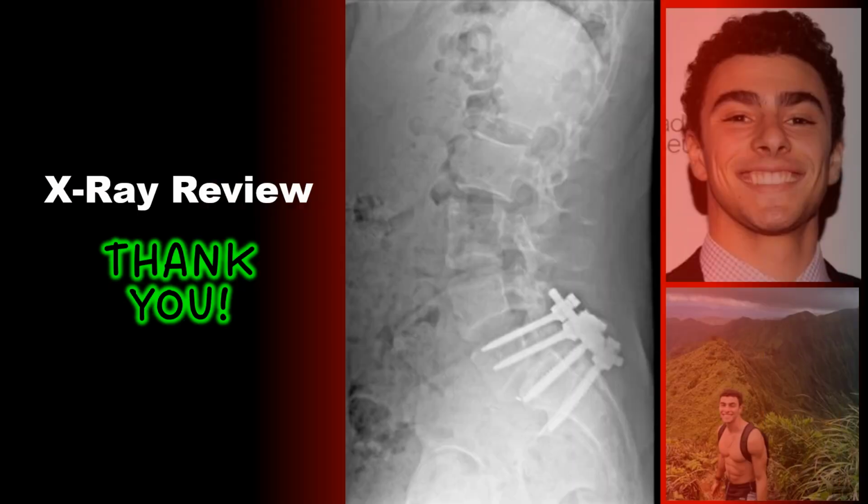In conclusion, I would say that this hardware would be suboptimally placed, and it would be interesting to see advanced imaging and whether or not there's any fibrosis and things like that, which would lead to more clinical symptoms.